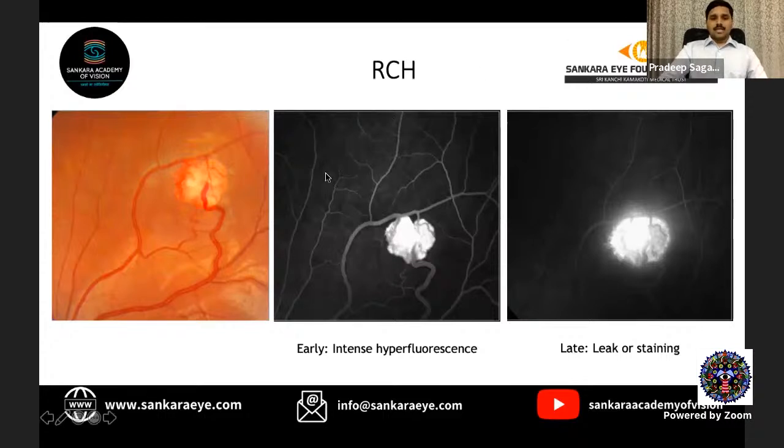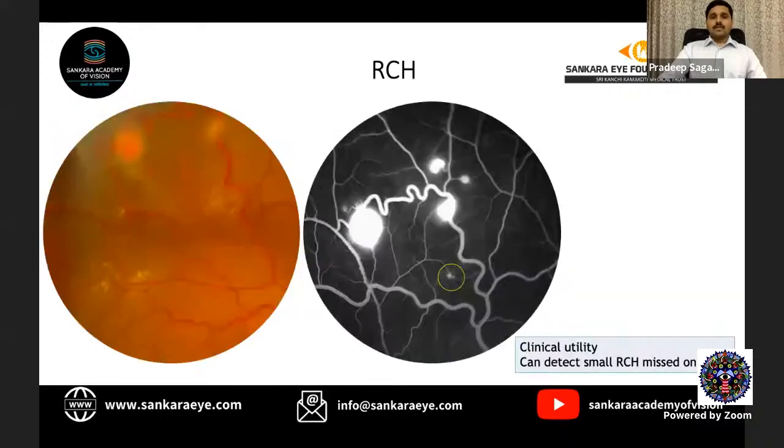Retinal capillary hemangioblastoma. In early phase, we see intense hyperfluorescence. In late phase, we see leak or staining. The clinical utility of fluorescein angiogram in retinal capillary hemangioblastoma is identification of small tumors which can be missed on clinical examination. Here we see that this is probably the area which has this small retinal capillary hemangioma, which was missed on clinical examination.